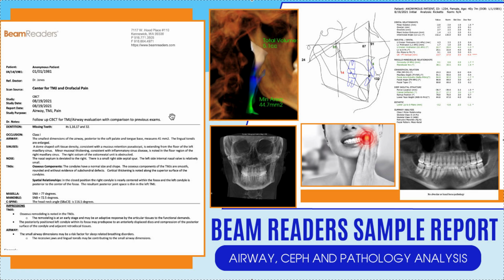So the report is this sucker right here, and I know it's going to be a little hard for you to read unless you have a big screen like I do, but basically this is a mock-up report, anonymous patient that they were able to give me. They're going to note the doctor's notes. The doctor was looking for a follow-up CBCT for TMJ and airway evaluation as comparison to previous exams, which I don't have access to, but that was the chief complaint. That is what the doctor wanted to know.